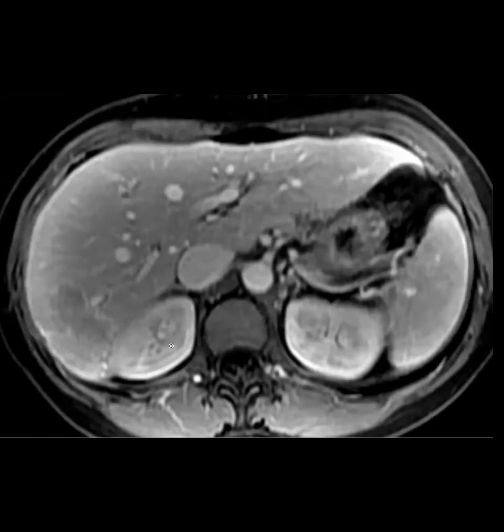I would not just let it go as an FNH until you have a very convincing Eovist study and/or biopsy. With this appearance, I would be leaning toward the adenoma. Okay, thank you, that's super helpful. Can you follow up the Eovist? Yeah, for sure. I recommended Eovist, and then after that, possibly tissue sampling. I'll come back and let everybody know what we get.